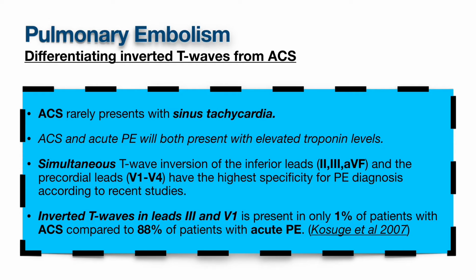All right. Sinus tachycardia isn't typically present with a STEMI. It is more common, and the most common rhythm found with acute PE. So that should also kind of aid in our diagnosis.